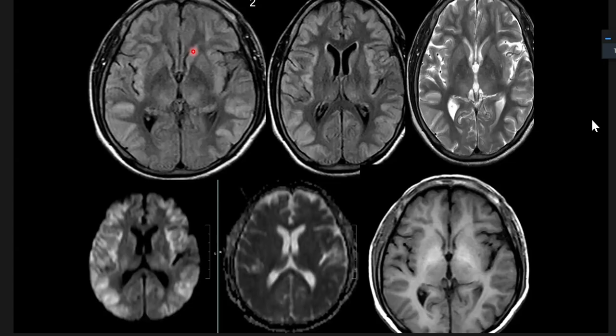Excellent. Ischemia also gives this. I mean, we have to see the cerebellum also, sir. Okay, forget about cerebellum. Only on these images, the cerebellum is normal. On these images, can it be this hypoxic ischemic insult?